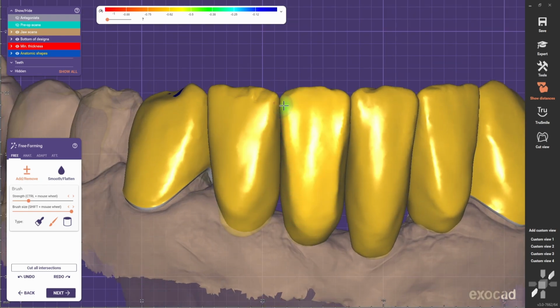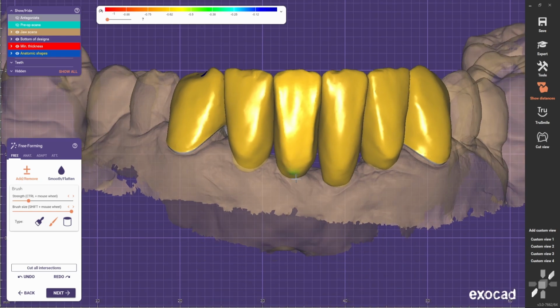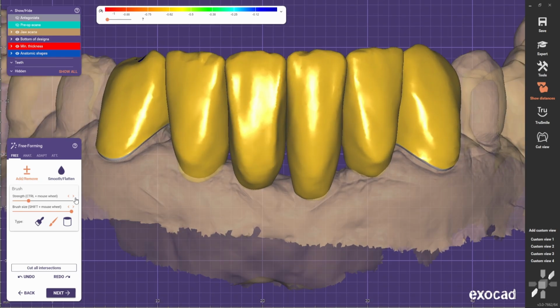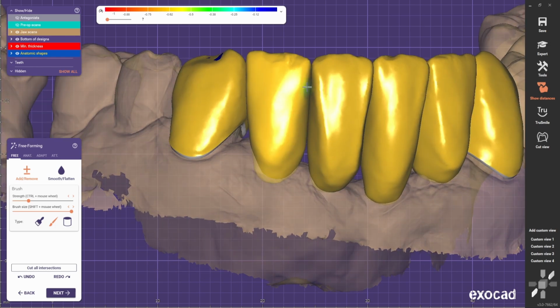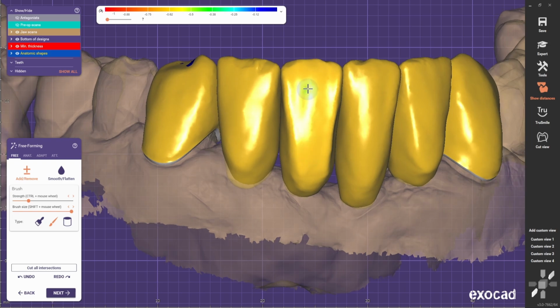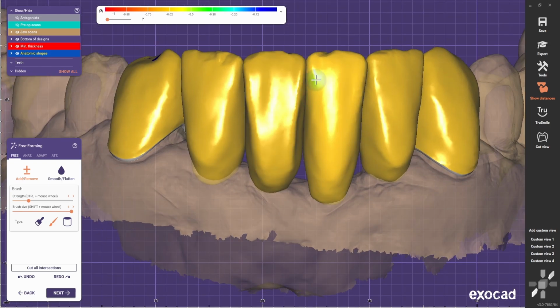Now the lowers usually are quite triangular, like this. Usually you don't really find big embrasures, it's just like the corners of the angles, they meet almost in the same place.